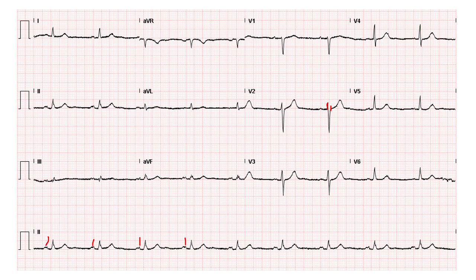The rate for this EKG we had determined previously to be about 54. So the rhythm in this EKG is in fact sinus bradycardia. So we know that the rhythm is coming from the sinus node, and we know that the heart rate is a little slow, so this is sinus bradycardia.